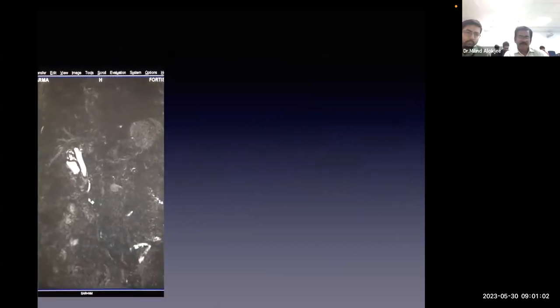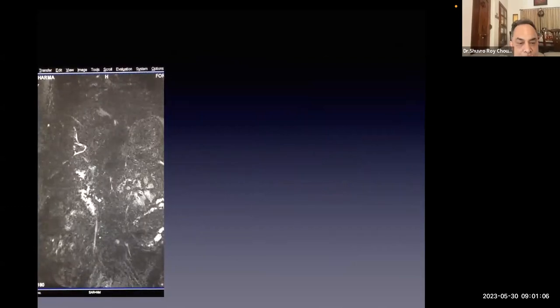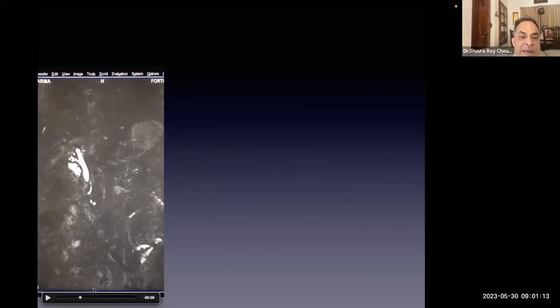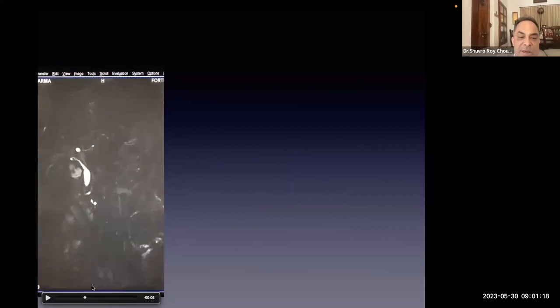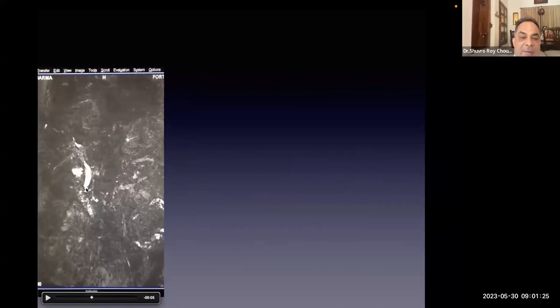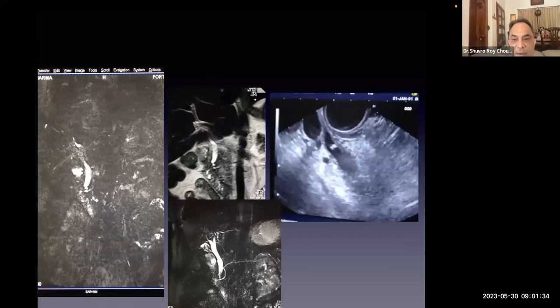So here is a typical movie. This is what I wanted to show you. This is the source image from which I would like to read what is actually going on, rather than the MIP image: a dilated bile duct, a borderline pancreatic duct, and a tiny little almost diverticulum coming from the end of the bile duct. See that tiny little diverticulum coming. Yeah, a normal-looking pancreatic duct.